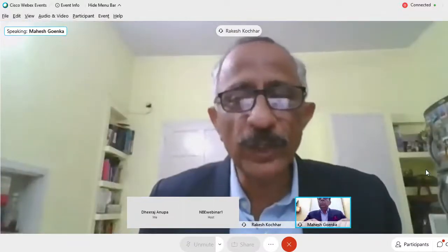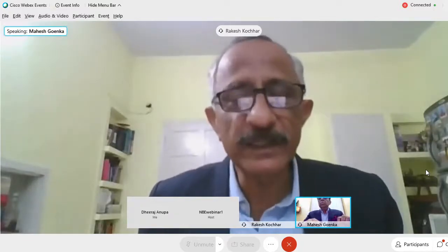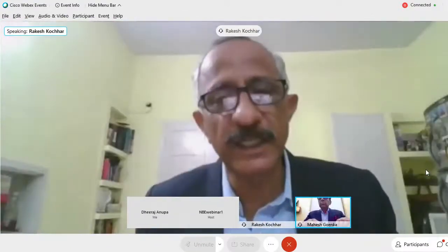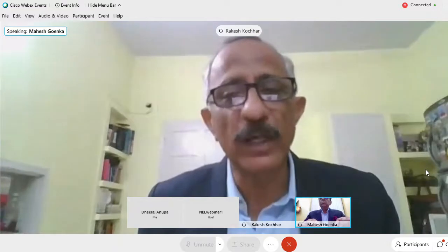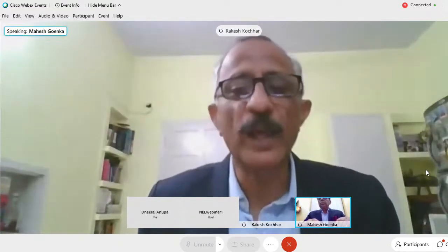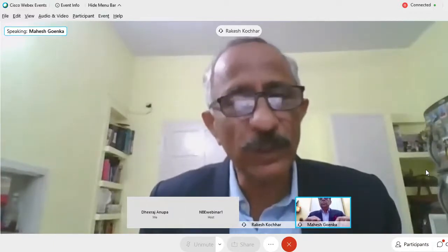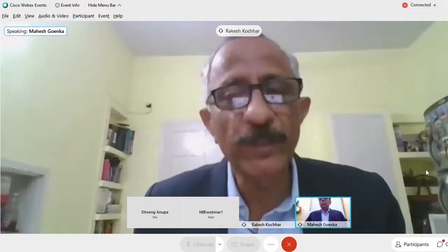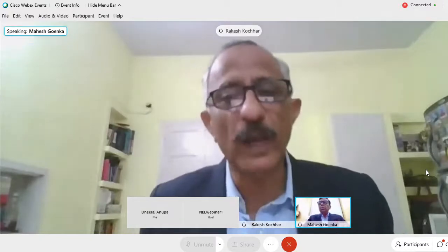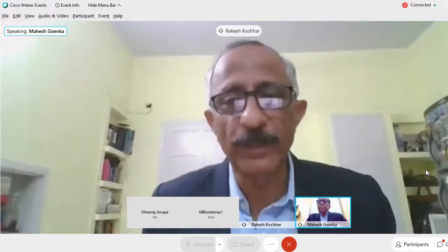As you go down into the duodenum and the jejunum, the folds will become closer to each other. Otherwise, if you are able to identify the angle of D2 to D3, you can say that you have entered D3, but it is all empirical that you have gone this much distance beyond the papilla and you estimate that you have entered the D3. If you do a careful examination, you can even go up to the D3, D4 or D4 also at times with a conventional upper GI scope, not necessarily an enteroscope.